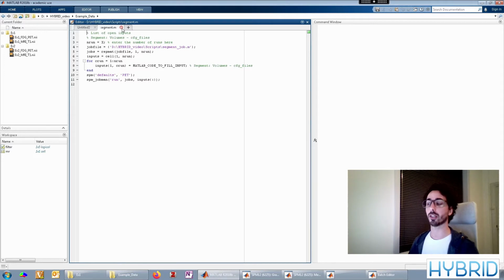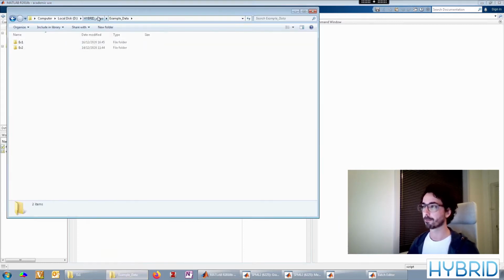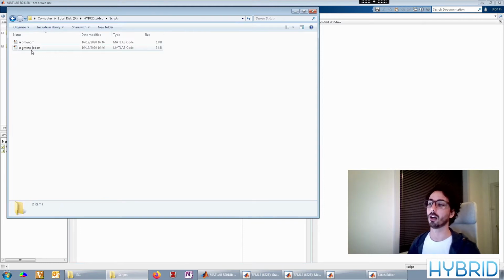Now that this is created, I'm actually not interested in this one because we're going to be building our own routine to iterate through the subjects. So I can close this one. What I want to show you is this other file here in the folder that we just created.